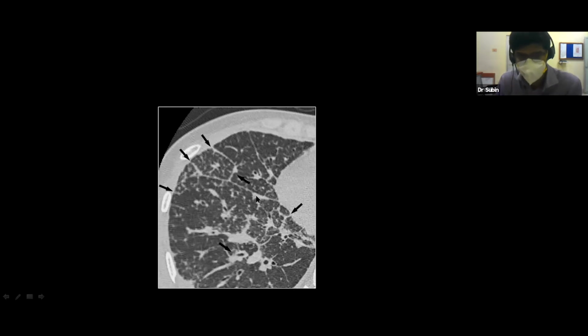So you see subpleural and fissural nodules, nodules in a perilymphatic distribution. Lymphatics are also seen around this vessel, so you can see peribronchovascular nodules. That's what we call it. This is a case of sarcoidosis. This is how very typical sarcoidosis looks. You have these fissural nodules, and it can have these. Basically, you look at the fissures first. If you see nodules along the fissure, then it's more likely to be perilymphatic nodules, which represent any kind of lymphatic problem.